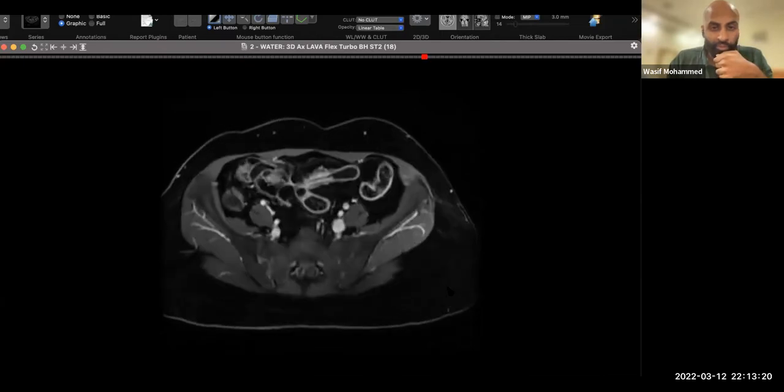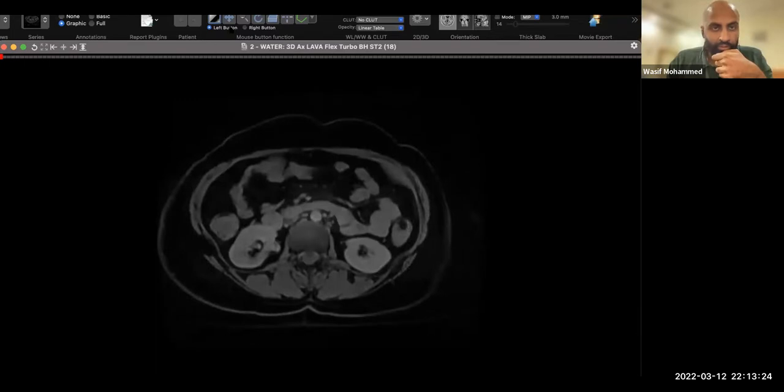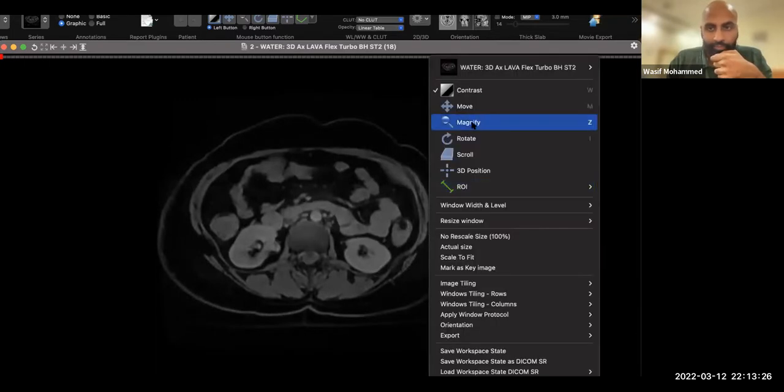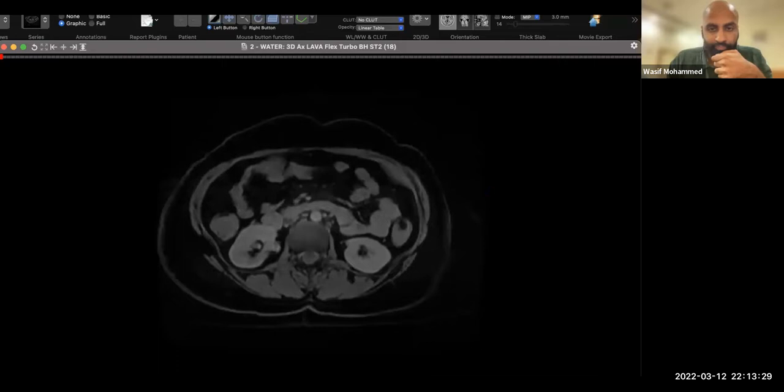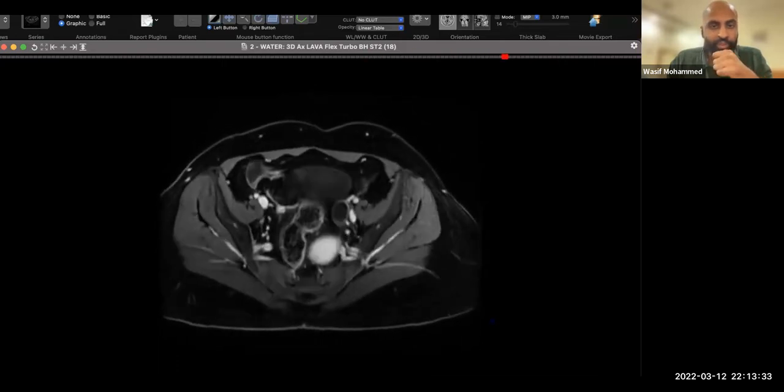Actually, I'll just scroll for you. So these, what images are these?